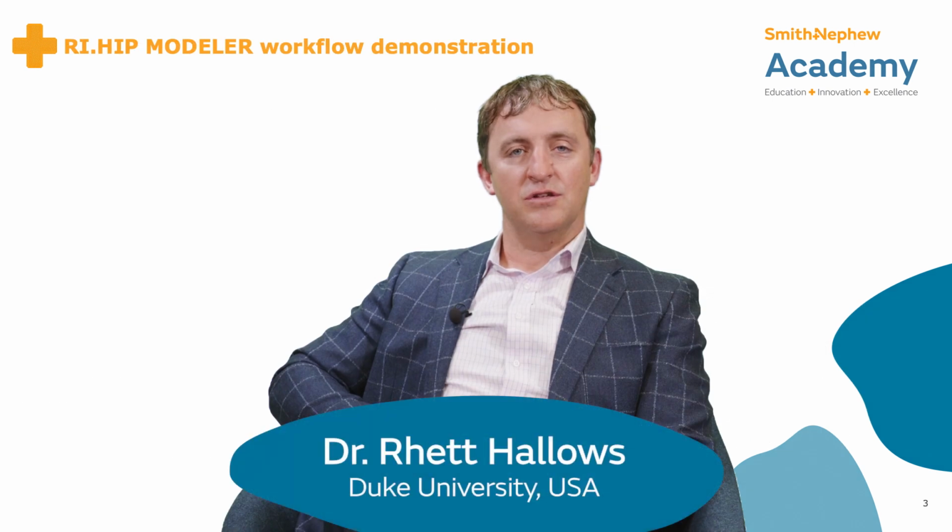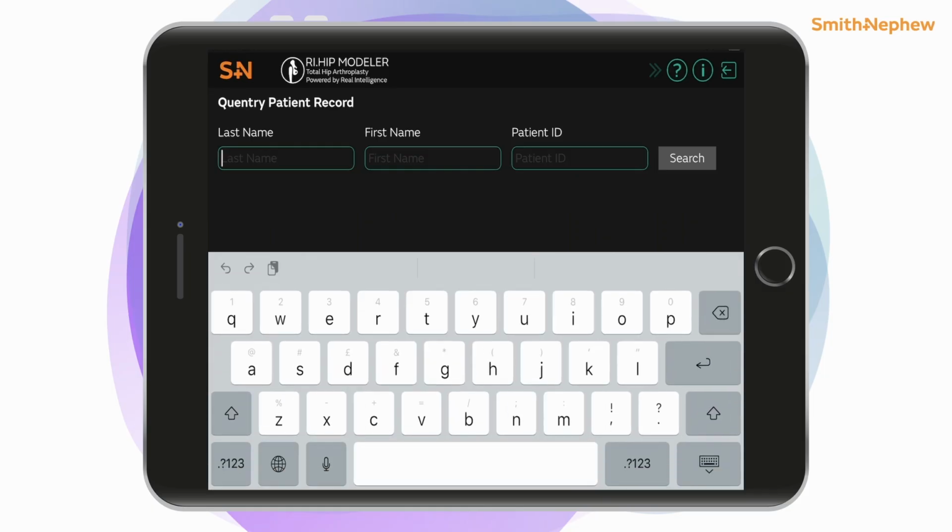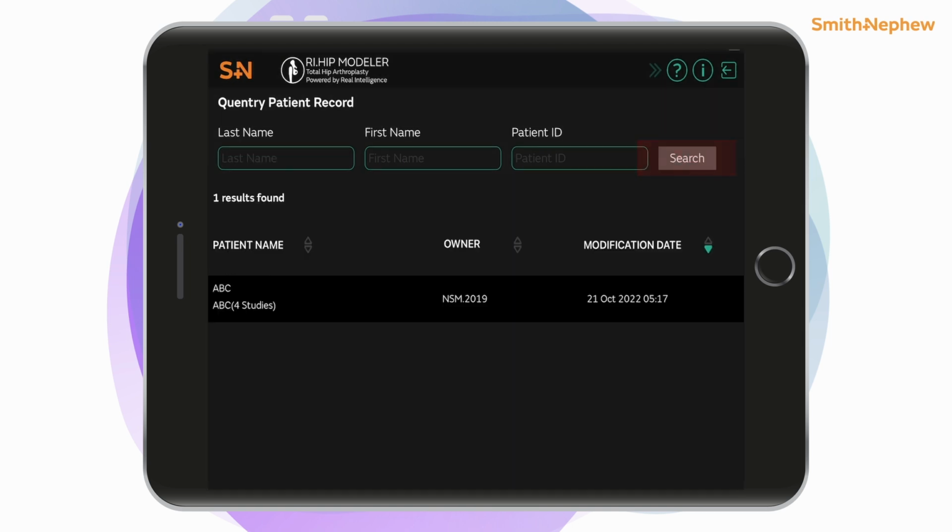I'm Rhett Hallows from Duke University, and I'm going to go through the RI Hip Modeler live workflow. First thing we're going to do is search for our patient name, and this patient is going to be named ABC. So we search, we see this come up.